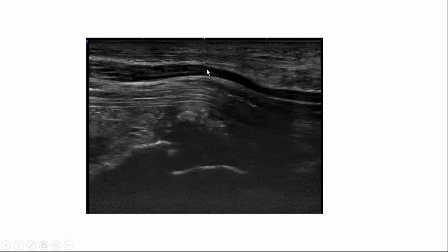So this is a secondary compression for sure, because this median nerve, although it's enlarged, it's not that big. It's not significantly larger. But the bigger problem is down under. It's not the median nerve. There is some joint process, some type of arthropathy or joint pathology which is occupying the space in the carpal tunnel and pushing everything up superficially. So there's pressure secondary to that on the median nerve.